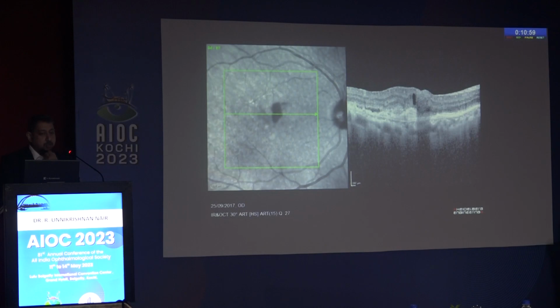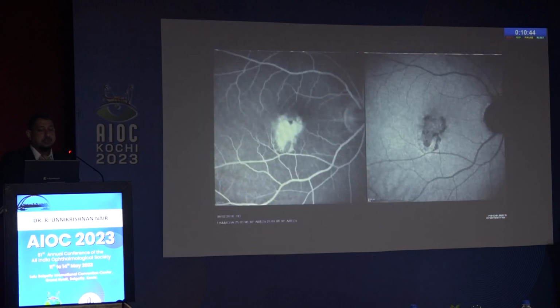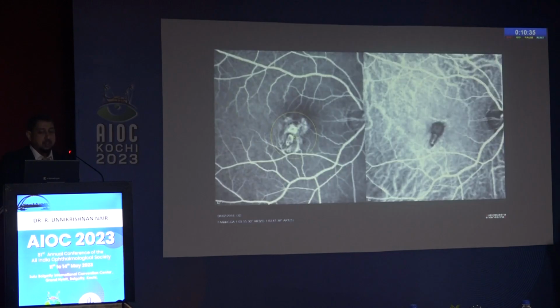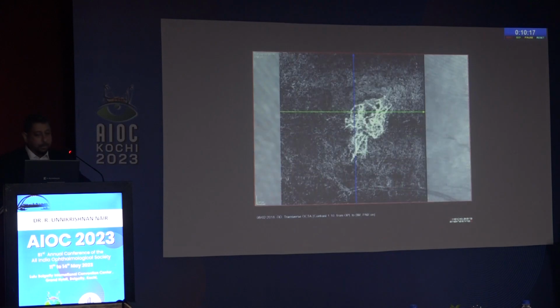Just to show a few brilliant uses of OCTA, you can see the structure of the vascular net much better than in any angiographic process, where pooling and leakage obscure the margins. Here you see the blood vessel edges very clearly. Just look at this patient, where it looks like a late phase indicating a CNVM on angiography, and that's the size on angiography. But when you look at this particular picture, you understand that the size is not what you saw. It is an oriented lesion, a horizontal, even slanted lesion with three major components going off to either side, and you see the vasculature better.